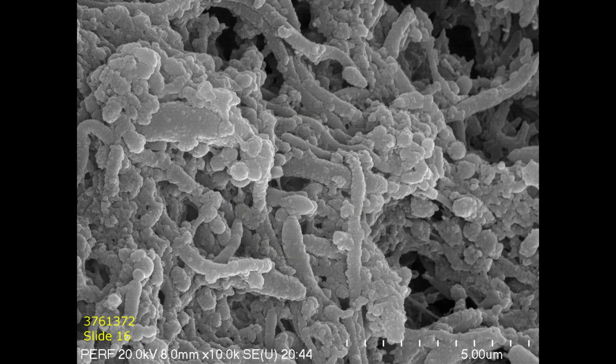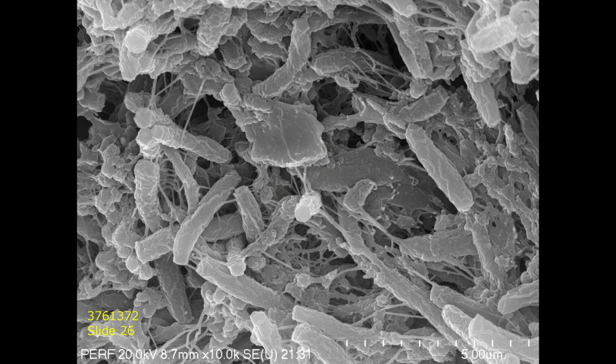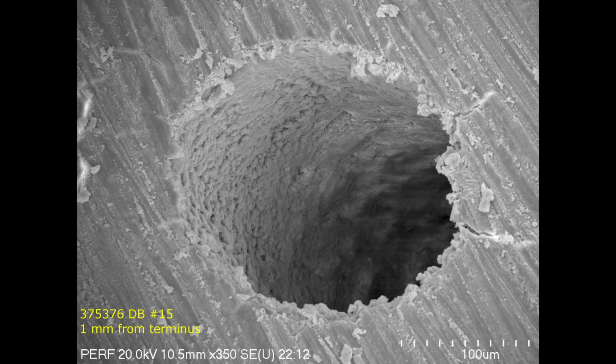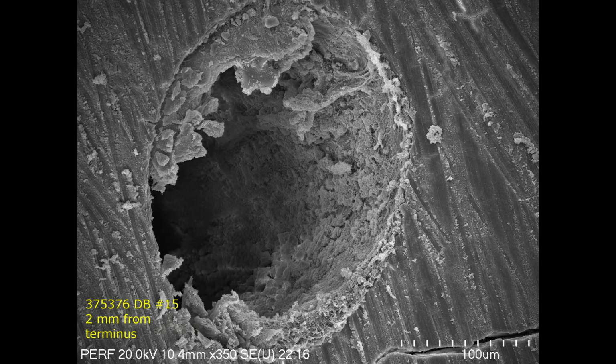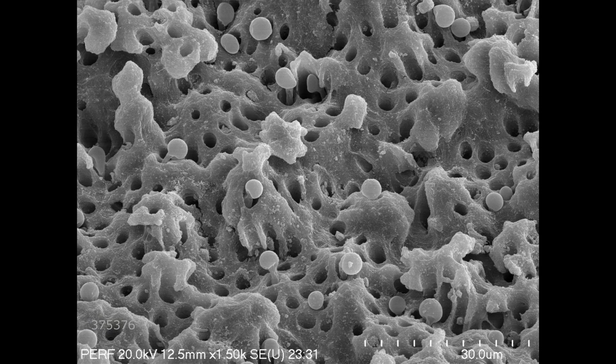This is some of the biofilm that's present. But when we actually went into these areas, in addition to the bacteria, we saw these odontoblasts, and this axial view of it shows it really well. You can see these have been minimally instrumented, and there was quite a bit of pulpal tissue still left. But in the areas where the material had been removed, you can see intact odontoblasts.